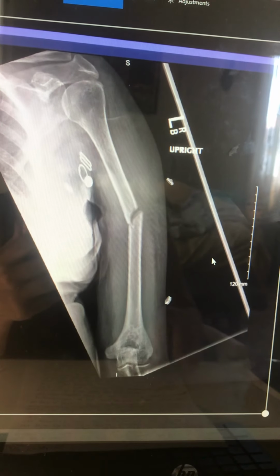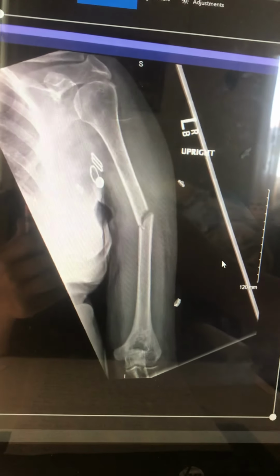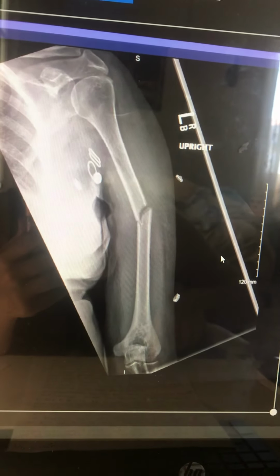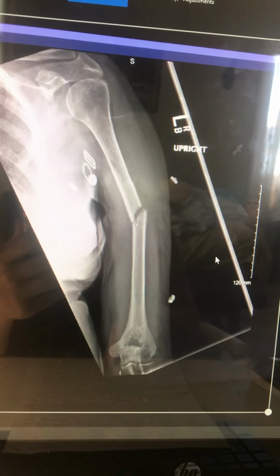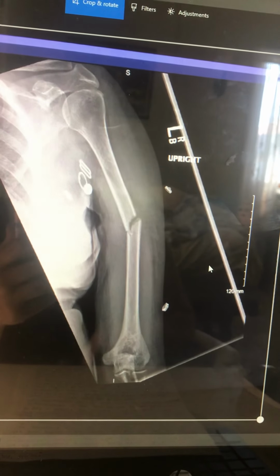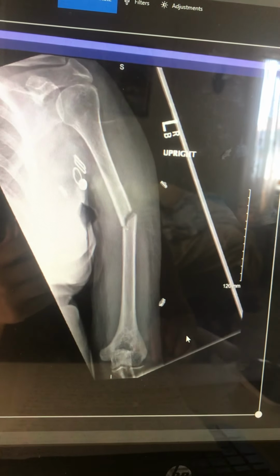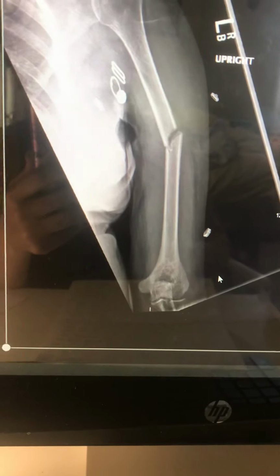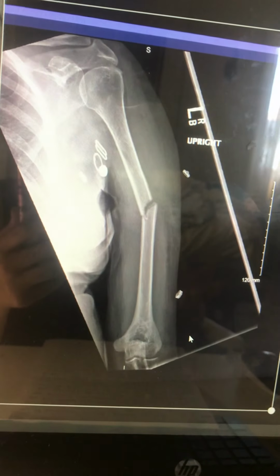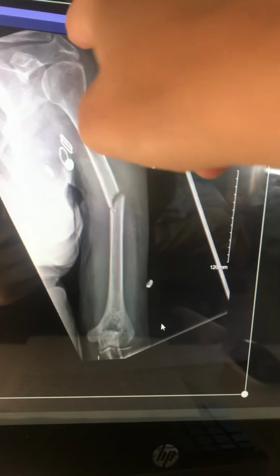The anatomy shown includes the acromion, the greater tubercle slightly in profile, the body of the humerus, the lateral and medial epicondyles down here, and the proximal radius and ulna, a little bit right there. You show that so you know that you got the entire humerus. You never want to clip that. You've got to get a little bit of it, and you've got to get the shoulder girdle, the acromion.